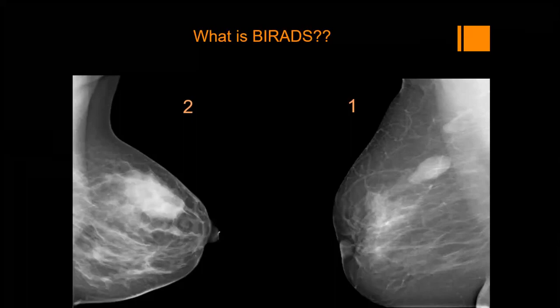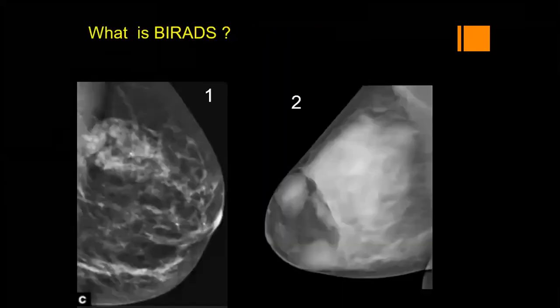But if I remember, a complex fibroadenoma was even upgraded, as I have shown you in previous examples, but you forget. It was partially cystic. So it was a complex fibroadenoma upgraded by ultrasound, biopsy was performed, and it was just a complex fibroadenoma. Okay, for excision.